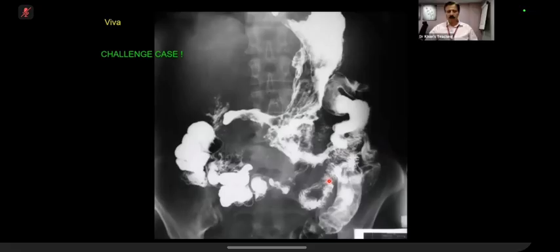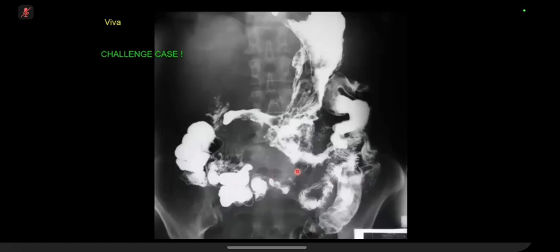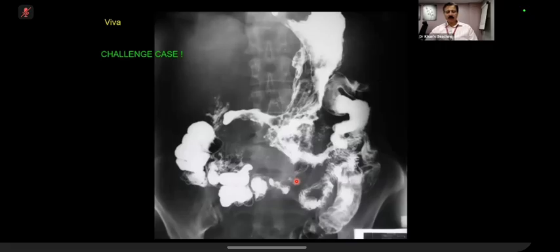Are you happy with the appearance of the stomach itself? No, I think the stomach looks abnormal. Irregularities and ulcerations, and perhaps under distension as well. So it could be a stomach malignancy on a background of Crohn's disease. Okay, okay, fine, well done.